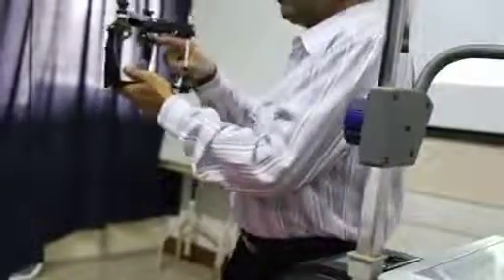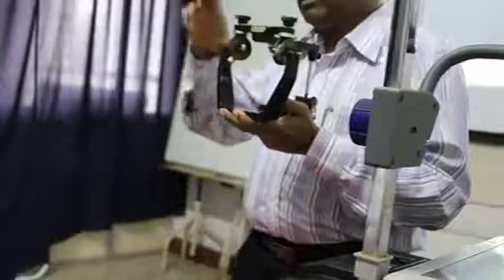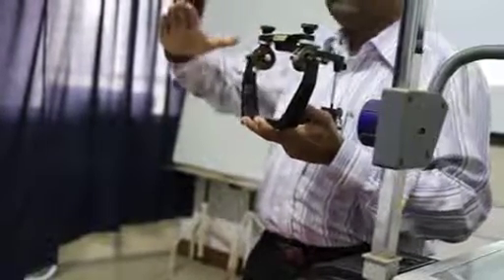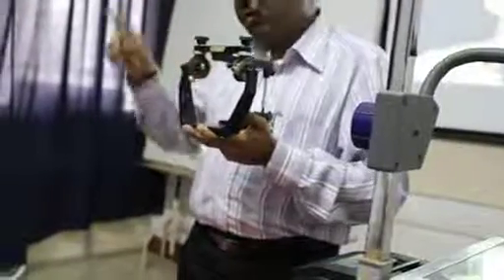Actually, one more thing here: it's straight, it's linear, not curvilinear. But we have some more articulators which are curvilinear also, where the condyle moves in a curve along respective curves. We can give that angle, but still it is not curvilinear. We can just give an angle. It can be straight, like 180 degrees, or some other angle. That's all we can give, rather than the whole curvilinear path of a condyle fossa.